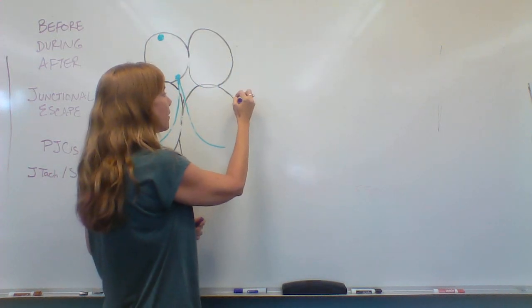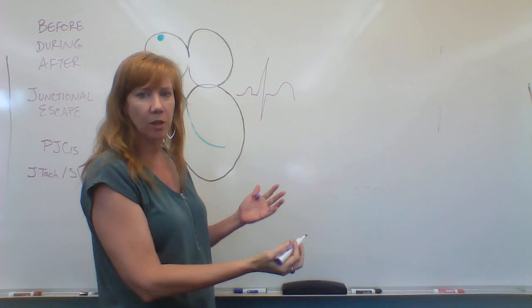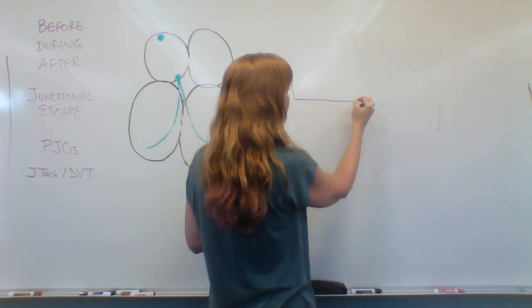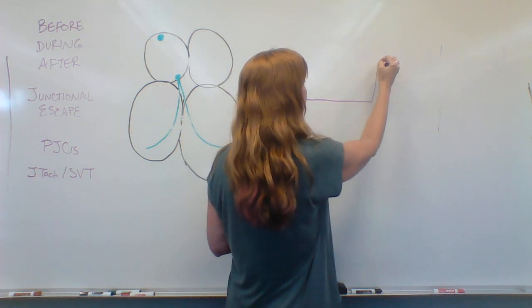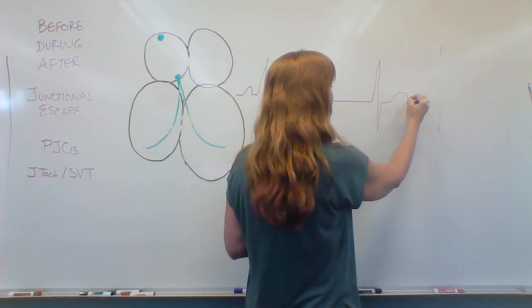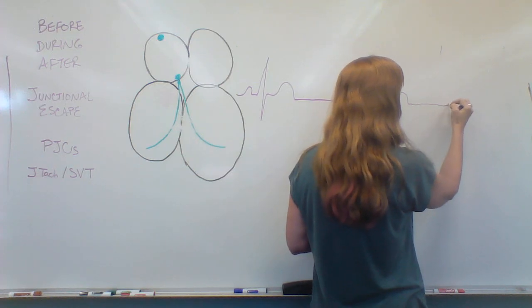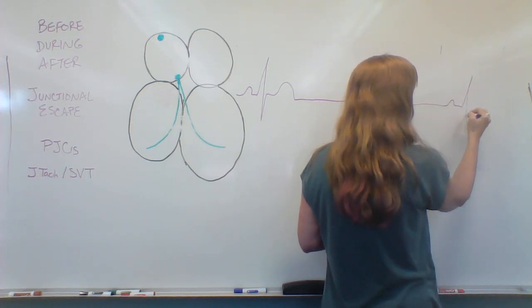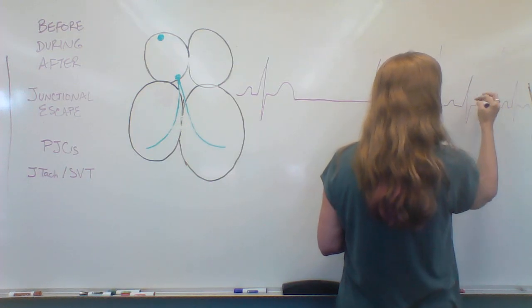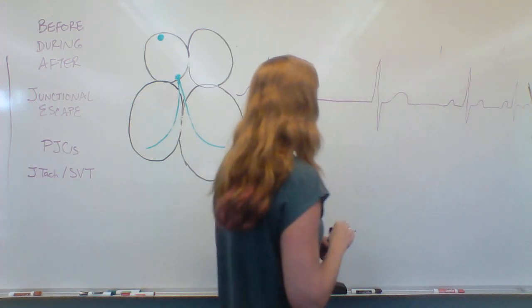So somebody's going along in sinus rhythm, and then for some reason they have one of those pauses like we were looking at on strips, and it's getting long, and you're like, Lord, that's getting to be a long pause, and then they just have one of these beats in here, no P wave, skinny QRS and a T, and then sinus rhythm resumes over here with some P's and QRS's and T's. Okay. Sinus rhythm resumes.